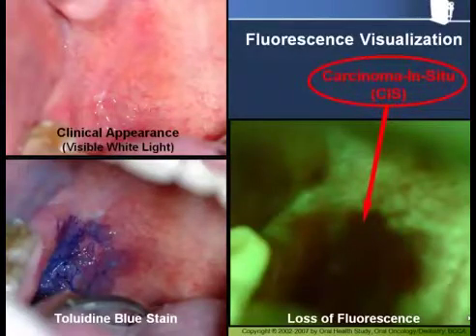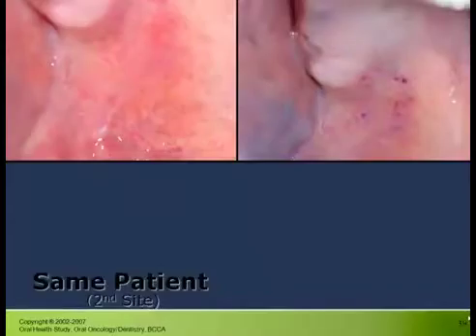The toluidine blue staining of the lesion is also shown in the bottom left photograph, and is somewhat typical of the experience of the researchers and clinicians at the BC Cancer Agency in Vancouver, BC, Canada, who use both tools clinically. The area showing loss of fluorescence is usually larger than the corresponding area that stains toluidine blue positive. Although there is not a global consensus on this, many experts believe that toluidine blue is more specific to higher grades of dysplasia and cancer, whereas fluorescence is quite sensitive to even quite mild types of tissue change, and is thus very good at identifying the full scope of mucosal involvement of a particular lesion.